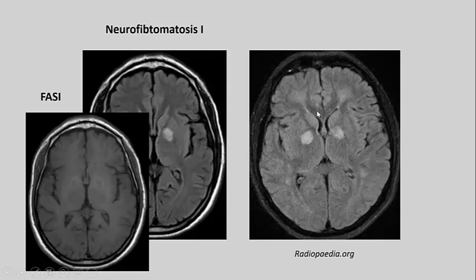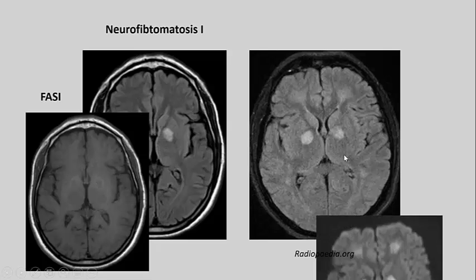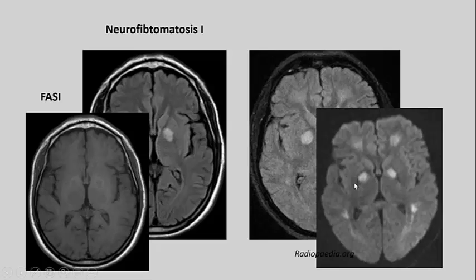In the other situation, this patient is 25 years old and was found unconscious in his bathroom, and you look at the diffusion weighted image, there is bilateral diffusion restriction in the globus pallidus. These are actually infarctions within the globus pallidus, and you know you are dealing with carbon monoxide poisoning. So two different patients, similar finding, however, these are two different clinical manifestations and two different outcomes.